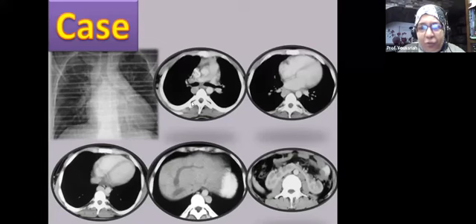We have to consider looking at the superior vena cava and the inferior vena cava. Here the superior vena cava is normal. Those streaks are due to the gush of contrast during injection, but it's normal. It's nothing thrombosed or anything. So we will go on.